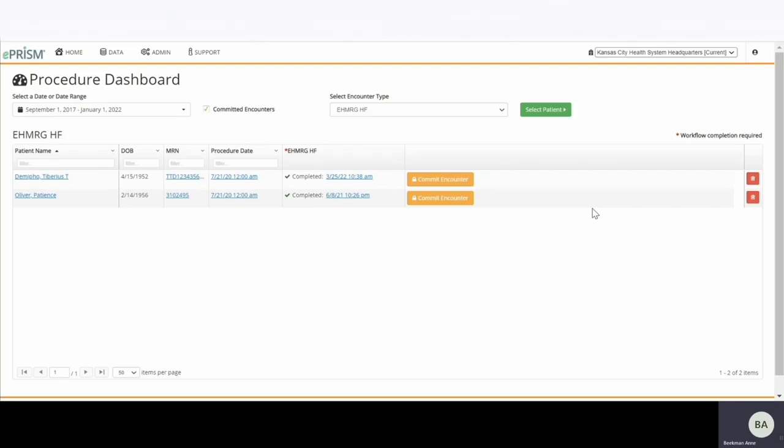The second question we get asked is, if I don't have an EMR or electronic health record, can I still use the tool? And if I do have one, can it be integrated? The answer is yes to both. If you don't have an EMR that you can use to help pull data elements into the predictive tool, and you'll see how there are elements that do cross over and populate during the demo, you can work the risk model off another device like an iPad and generate the recommendations in a standardized fashion that way.